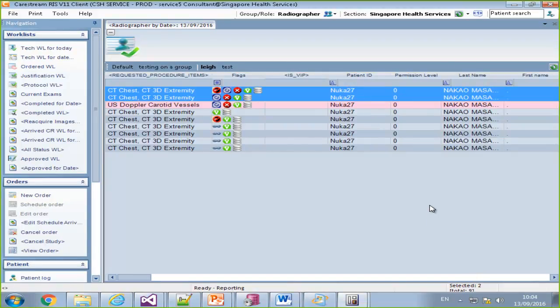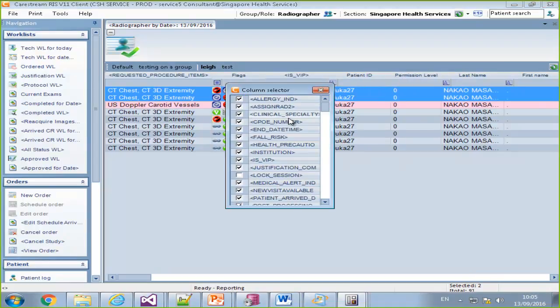Okay, these are all the new studies that we created before. Let's see, let's put the study. So we have, no, actually, it's not a study. Study. Procedure description? Yeah. Procedure description is the study? I think maybe, yeah. Okay.